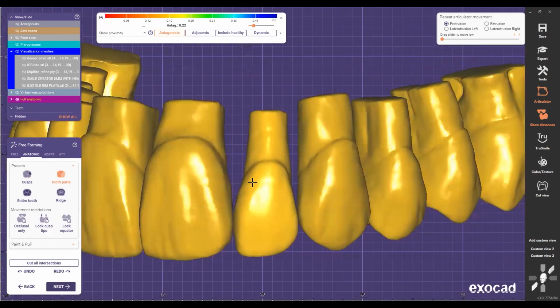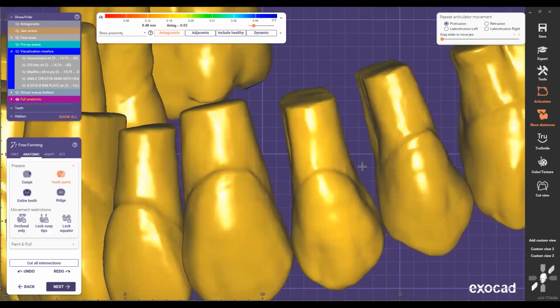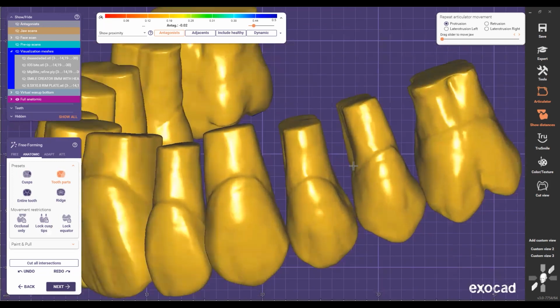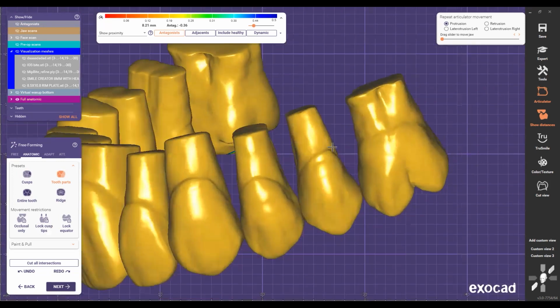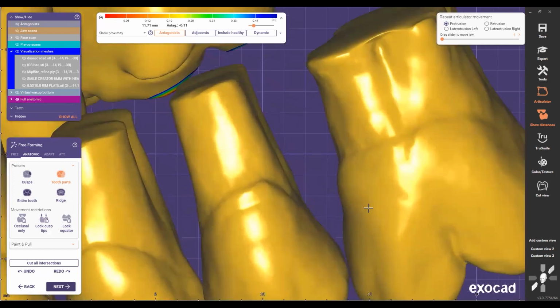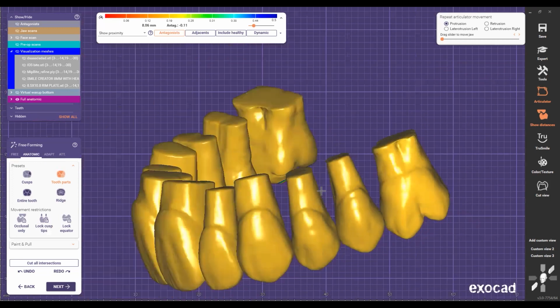Now I'm going to go to this side, and I can try to close it from the back as well, so I don't change the anatomy of the teeth too much. I don't want to have too much pink showing in these papillas, because sometimes I see a lot of designs where the pink is all the way right here. Aesthetically, it doesn't look nice.